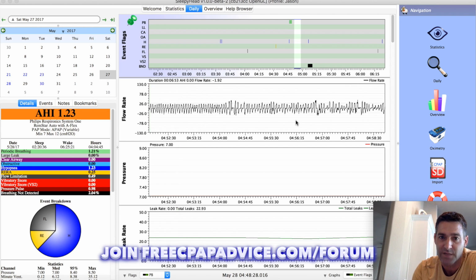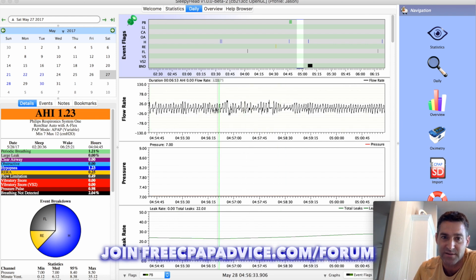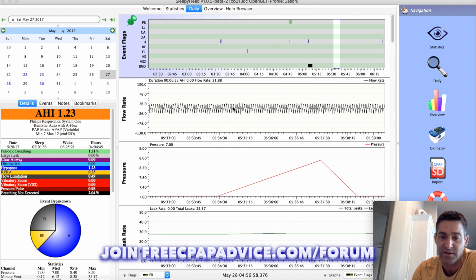Otherwise, just kind of ignore it. Here's another good example. You see all this choppiness? This is wake. This is what someone looks like when they're awake and they're moving around. A lot of times you'll see events being tagged in those periods. Ignore them.